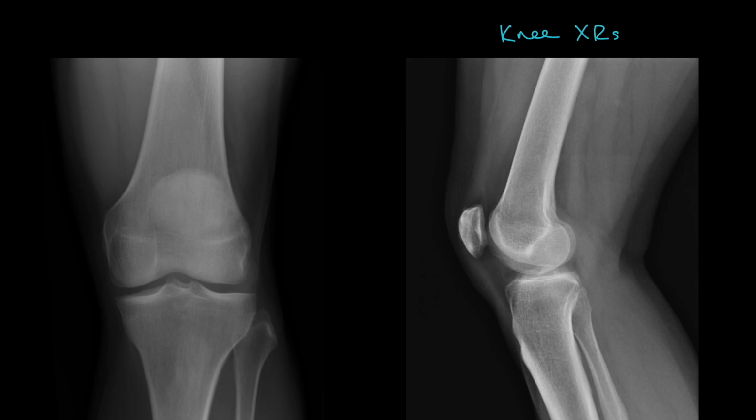Moving on to B for bones, trace the bony borders of all of these. So in that AP view, we can trace our patella over here. We then trace the borders of the femur at the condyles again, and the epicondyles, making sure to look for any areas of breakages, any sharp changes in the borders to suggest fractures.